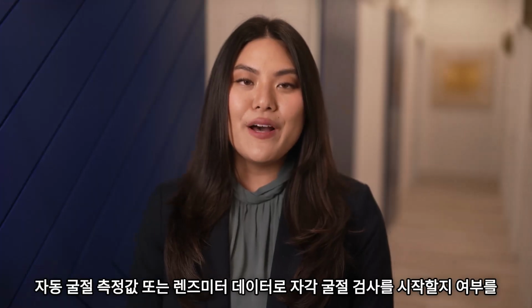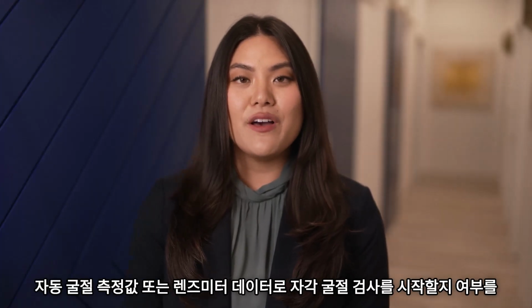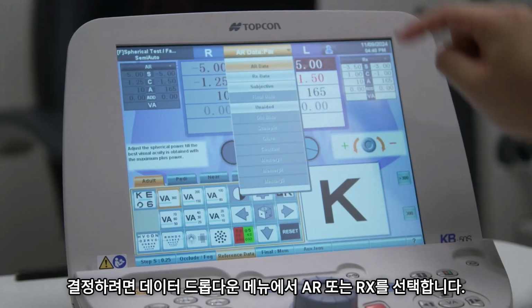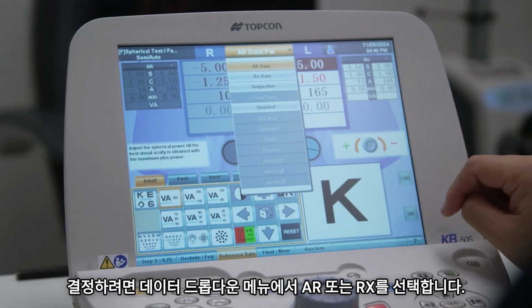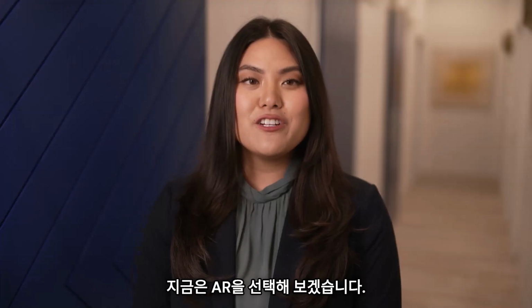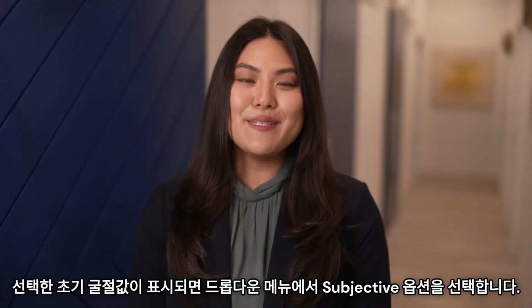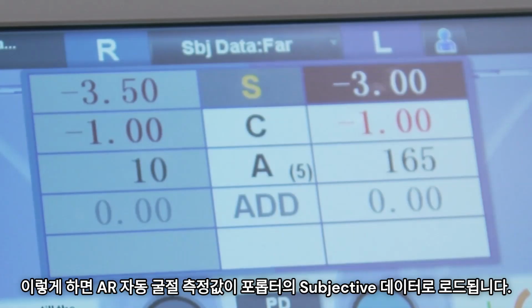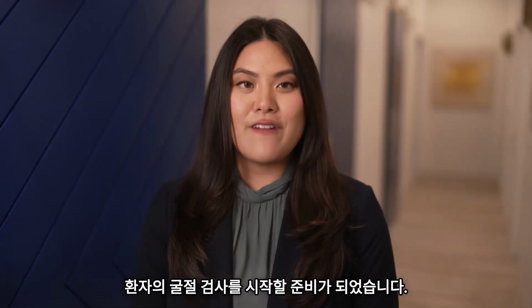To decide if you want to begin your subjective refraction with the autorefraction or Lensmeter data, select AR or RX from the data drop-down menu. We'll choose AR. When your chosen starting refraction values are displayed, select the subjective option from the drop-down menu. This will load the AR autorefractor values as the subjective data in the phoropter. You are now ready to refract the patient.